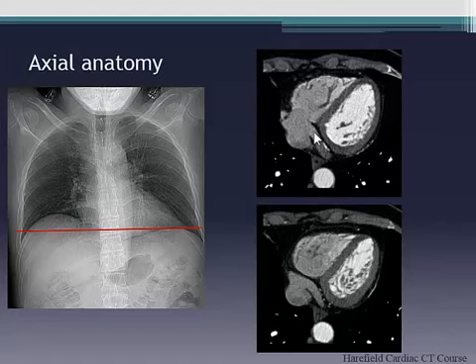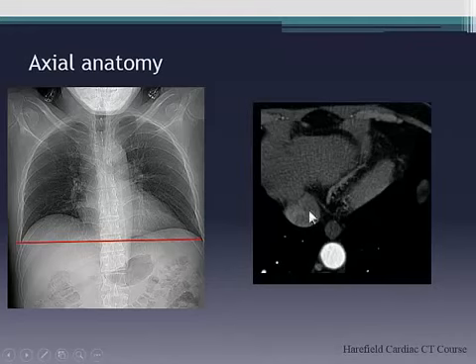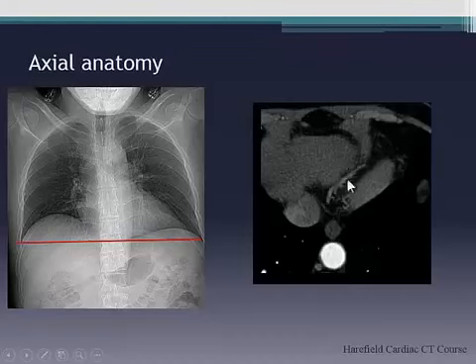You'll see if there's deroofing of the coronary sinus, which is obviously rare, but you don't want to miss the rarities. That's the point. Okay, so as you head further south, then you start getting into IVC, joining into the hepatic veins. You might see the hepatic veins. Obviously, in this case, there's a coronary vein here.